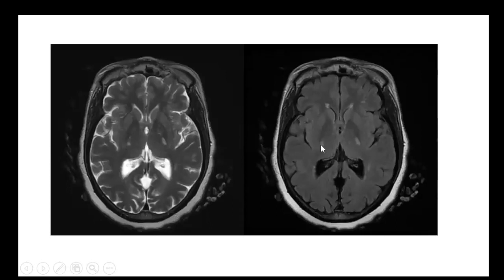And this is actually considered a typical finding in ALS. So it's one of the things you should look for. This is abnormal signal along the corticospinal tracts. But the fact that it's a little irregular maybe favors something else. And in this case, it turned out to be neurosyphilis. Now, this is the first case I've ever seen, which is saying something in a lot of years, of proven neurosyphilis with imaging findings. That makes sense, I guess. So you're seeing probably some Wallerian degeneration of the corticospinal tracts in this patient with proven neurosyphilis.